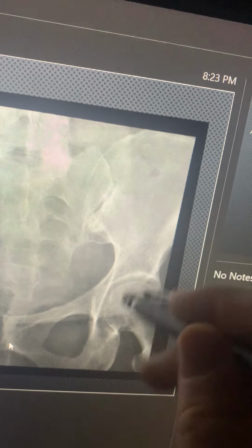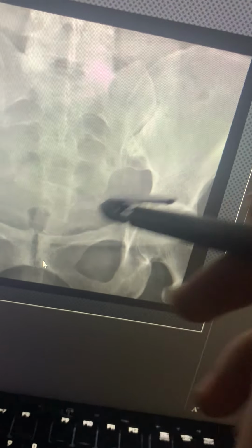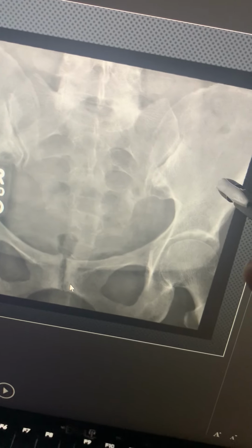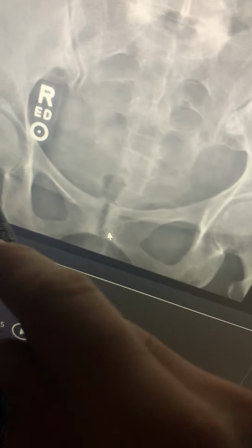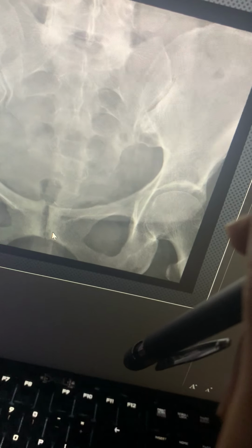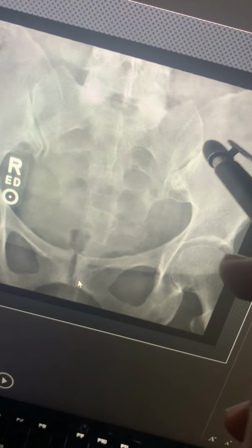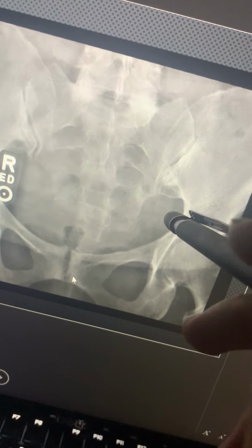Like I said, this could have been collimated in since we do have femoral heads, but we decided not to post-collimate crop it out due to the fact that we can possibly find some incidental findings here, anywhere in position. Since the patient's chief complaint was that she fell 2 days prior.